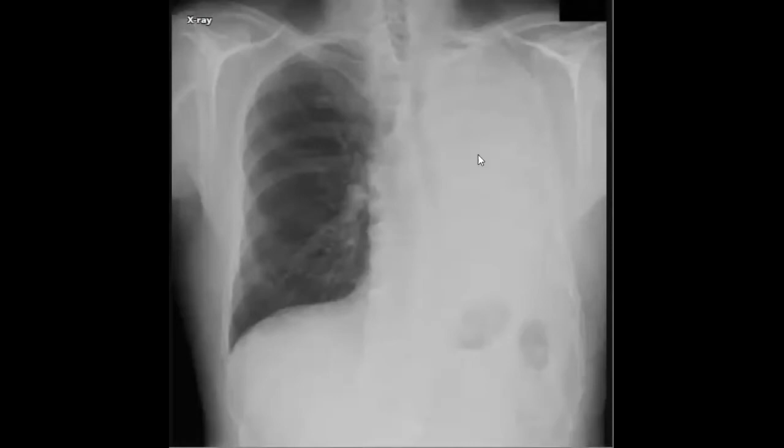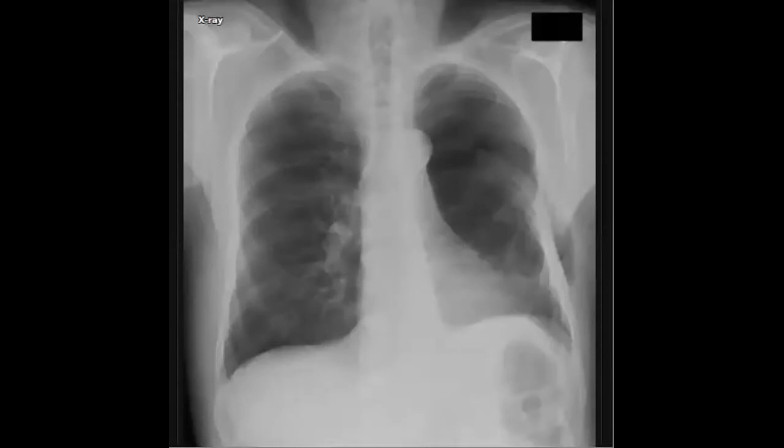So it is normal to see this post-operatively, and it is normal that you see opacification. The abnormal thing is seeing increasing air in the X-rays. If you see increasing air in the post-operative X-rays, this means that this patient may develop a bronchopleural fistula, which is not a good sign. So you should make a follow-up of this patient to check if there is any abnormality.